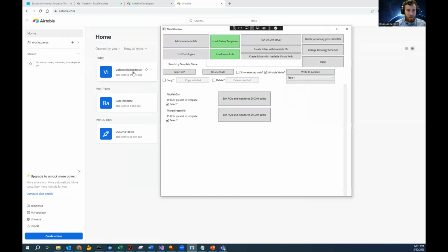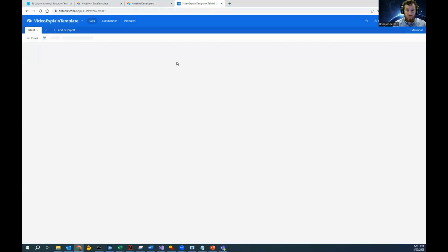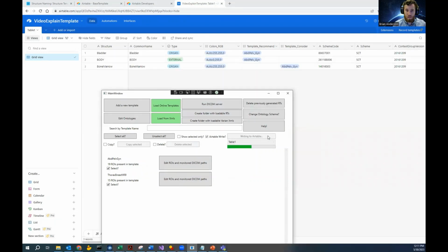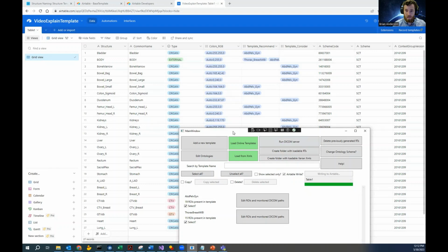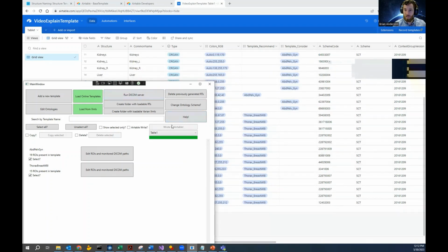But before I click that, I'm actually going to come over here so we can watch it populate. Open. Right. Then write to Airtable. So it's writing. There they all go. Let me just get them up there. All right, and it says that it's all done.